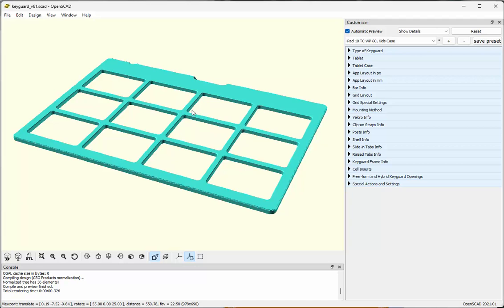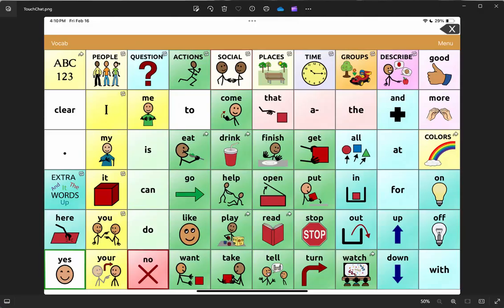Now I'm going to decide how to deal with those various bars, whether to expose them or hide them based on that screenshot. So let's get the screenshot back up. This is the status bar at the very top.